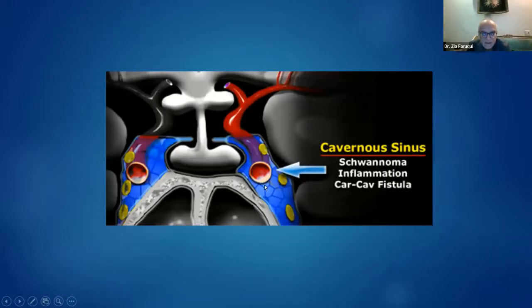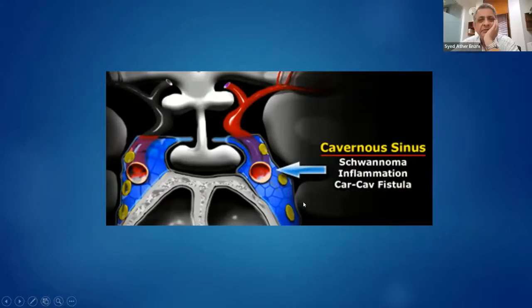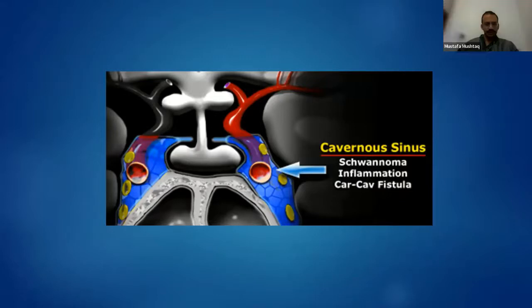So again, anybody wants to identify the structures? So this is the carotid artery. What is this? Dr. Nasser, could you please read that? So what are these 3 lateral structures? Wait, who is telling? I'm gonna pick some. Amar bhai. Dr. Adnan, Dr. Amar, anyone?